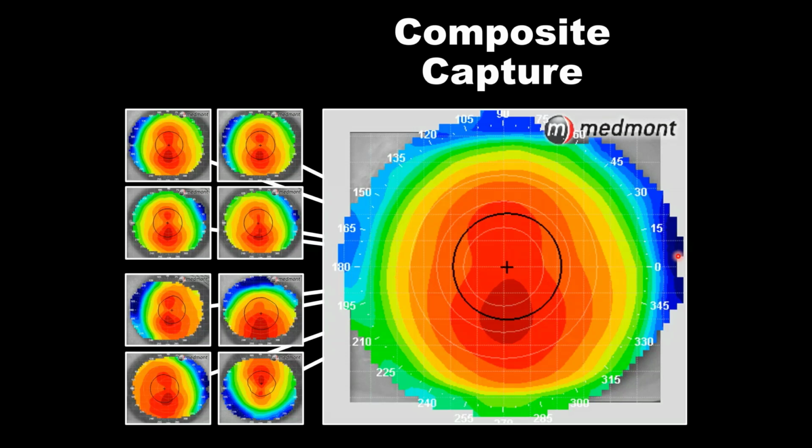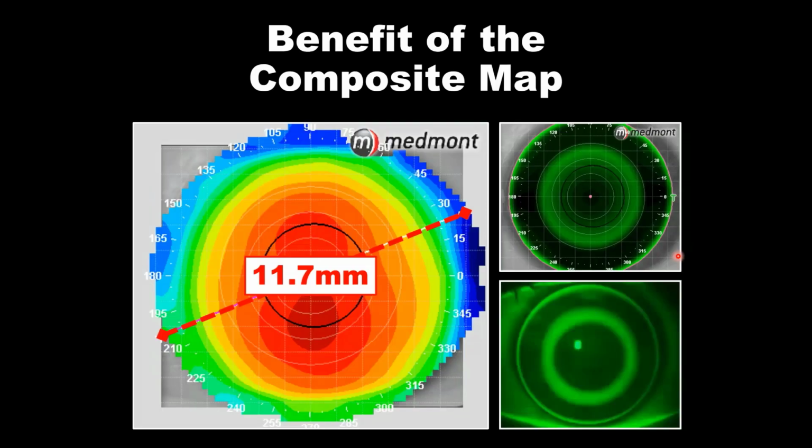If you're trying to build an ortho-K lens, a scleral lens, a corneal GP for presbyopia, if you're doing any kind of specialty contact lens, then you want as many data points as possible. So doing this type of capture really makes sense. And orthokeratology is such a good example where we require a lens that has to be micron accurate. It has to be hyper accurate. So we want this topography that we build our lens off of to be as accurate as it possibly can.